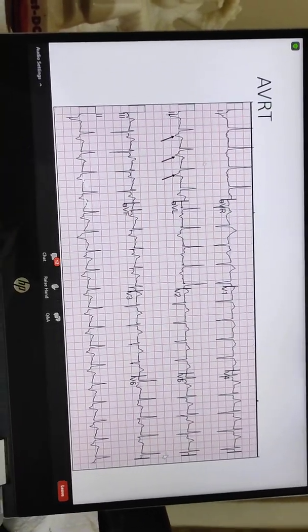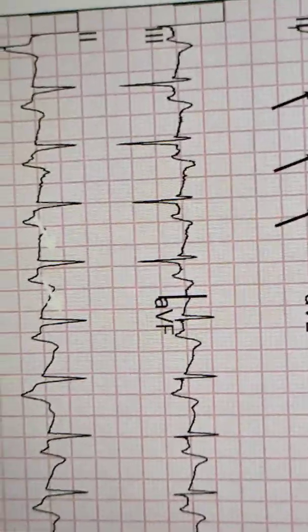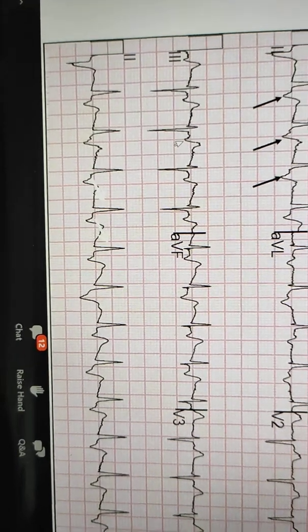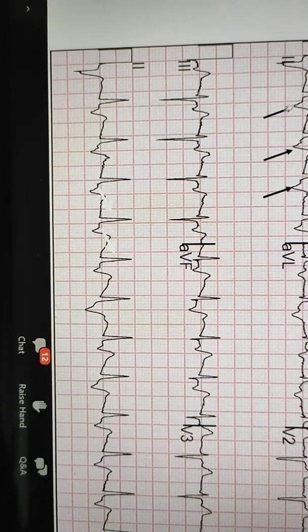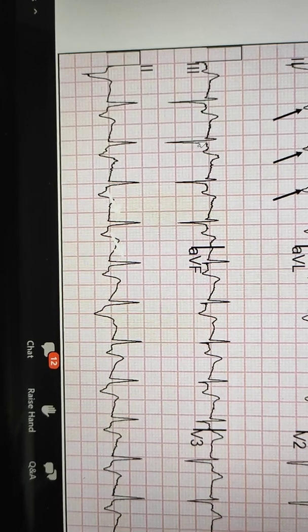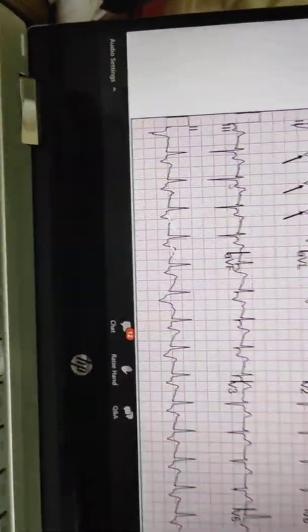You can look at this ECG here. The patient has a narrow QRS complex regular tachycardia. Once I have a narrow QRS complex tachycardia, what I have to see is whether I have an inverted P wave like this in the inferior leads after the QRS inscription. As you can see now, the QRS has come, and my ST segment is deformed by the inverted or negative P waves.